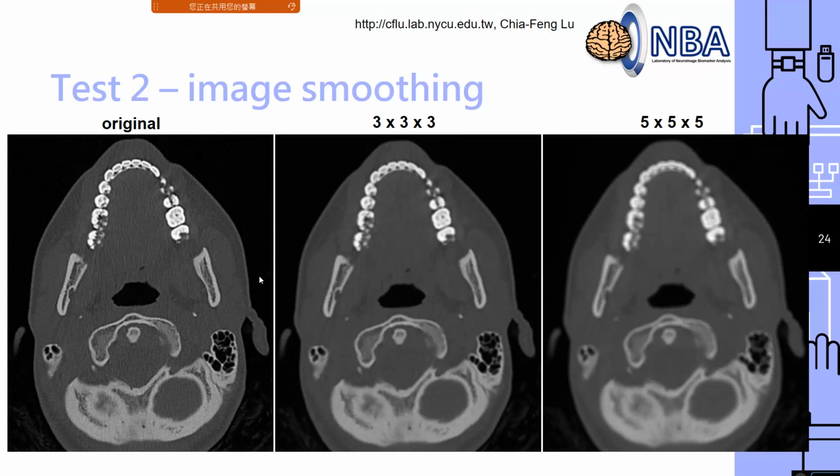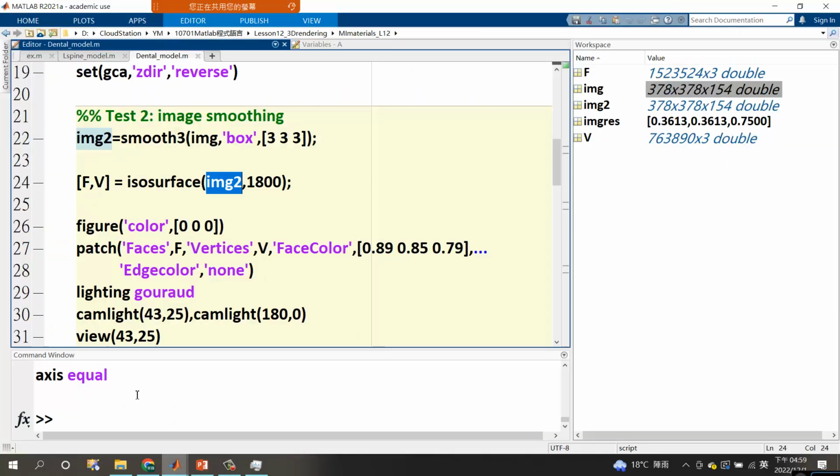So you can try it again. These are the parameters that you can try. Which kind of parameter can give you the ideal result that you think would be the most suitable condition for the 3D printing? You can think about this, okay? So feel free to try it. I can try to make a crazy one for you. For example, it's definitely too big. Anyway, 9 by 9 by 9, okay? Let me try it. Let's see what would happen. Just wait for a couple seconds. You will see the results.